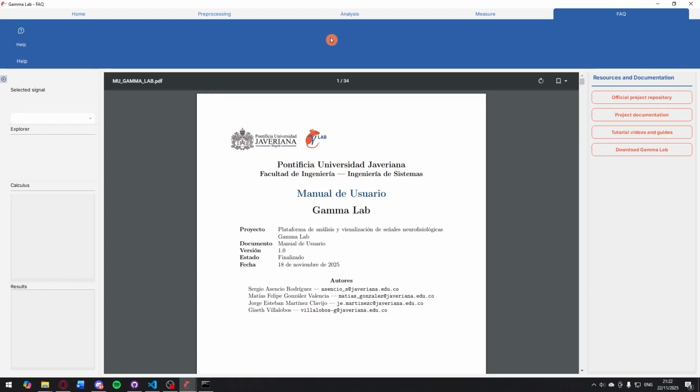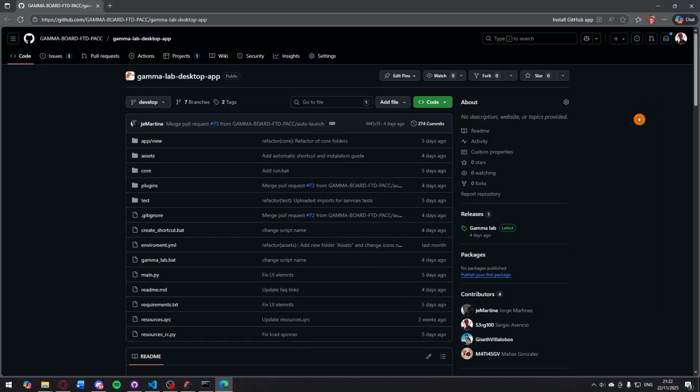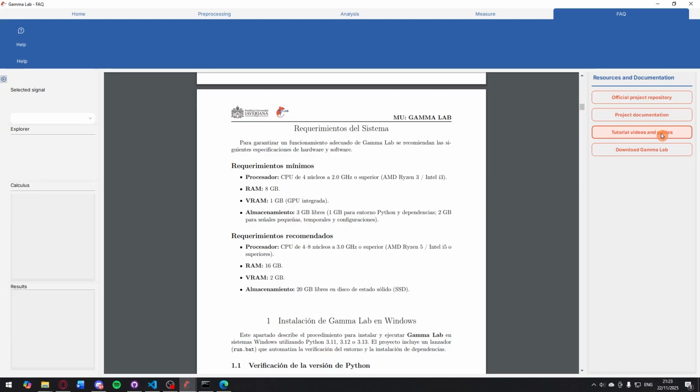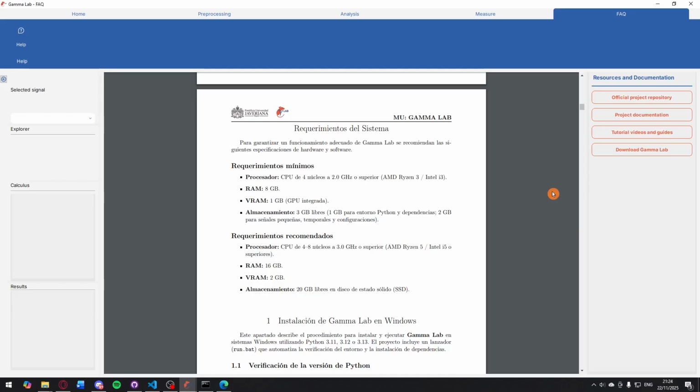FAQ. In the FAQ section, I can access all official project resources. The user manual. The official GitHub repository. The complete project documentation. The tutorial video playlist. And the link to download the latest version of GammaLab. This section serves as a support center and extended documentation for users.